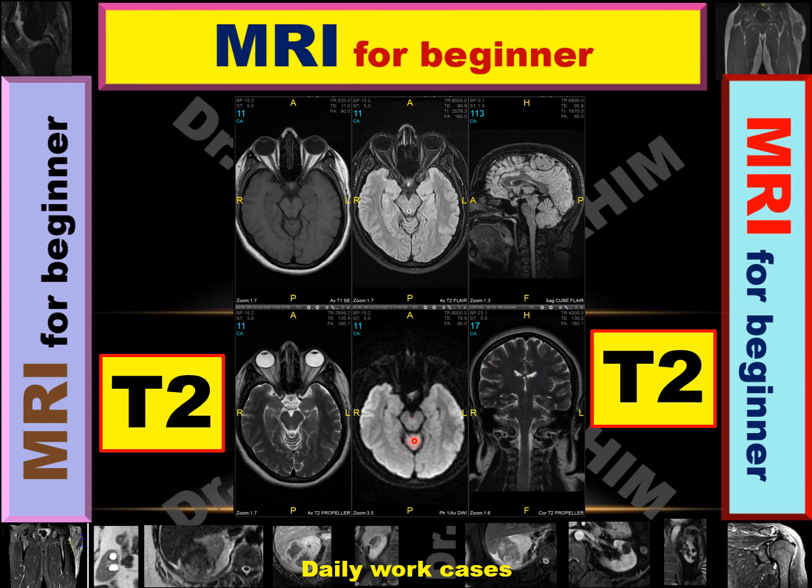However, when CSF is dark, like in all the other images, return to the white matter. Look at white matter. If white matter appears brighter than the gray matter, this is a T1, also confirmed by the presence of high signal of subcutaneous fat and retroorbital fat. As we see here, the extraocular muscle and the optic nerve appear within the bright fat. The globe fluid also appears low signal like CSF.